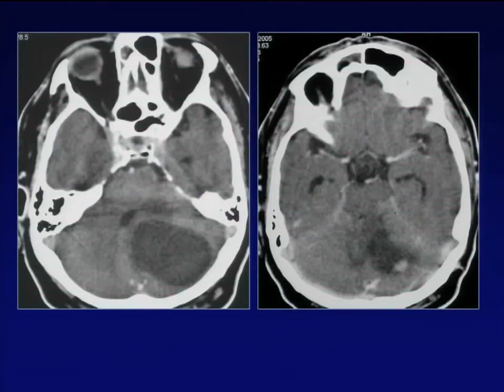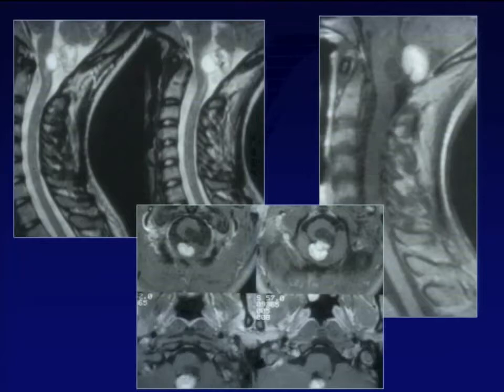And in other cases, when we are dealing with an infratentorial cystic tumor, this is the CT, and post-contrast, going to the upper cuts, you see this dot which enhances, this mural nodule which is characteristic of a hemangioblastoma. Hemangioblastomas sometimes tend to cross the craniocervical junction, going from up to the neck. And this is the cystic part. You see post-contrast without enhancement. And this is the nodule, which in this case is larger, which enhances.